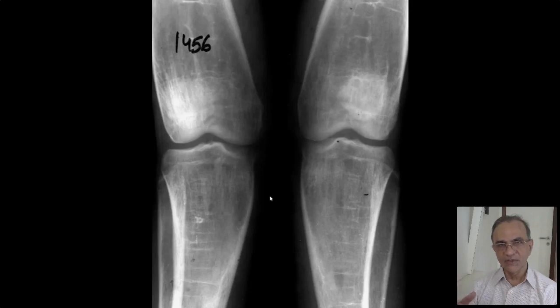So this is non-tubulation. Coming from the diaphysis, it comes to the metaphysis and the epiphyseal region, it doesn't show the normal tubulation. So this is some form of dysplasia, straight off. Even if it's not so gross, anywhere in the skeleton, if you see non-tubulation of bone, it's very likely to be a dysplasia, always abnormal.